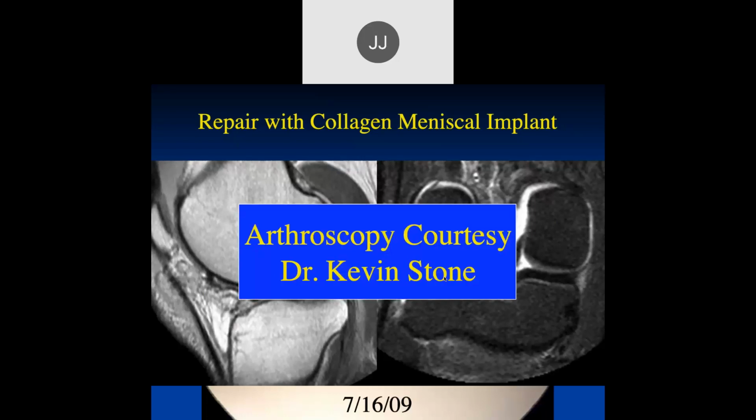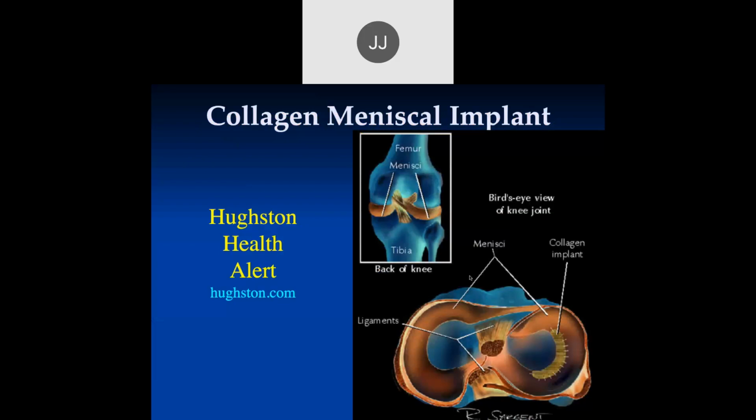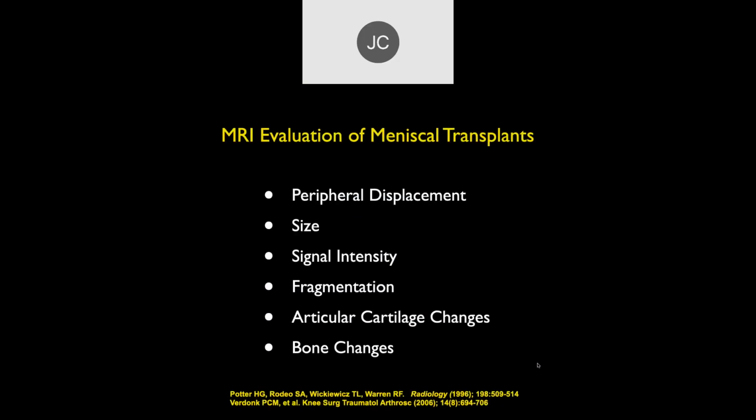Okay. And then here's just some information about collagen meniscal implants. They can put them in to help improve the defect in a meniscus. Okay, and that brings us into a little discussion about meniscal transplants.